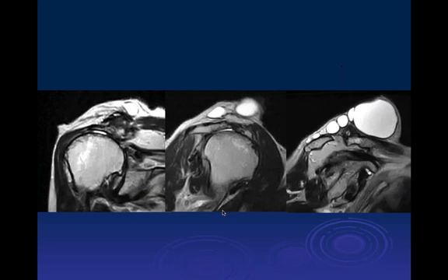Jeff, what do you think of this case? So it looks like we have three images. The shoulder looks like on the left, I think it's a T1 and T2. There's some T2. They're all T2s. Yeah, this is coronal. Well, the first thing is that there is a large fluid collection overlying the superior aspect of the shoulder within the soft tissues. Certainly it's superficial to the distal clavicle and acromion.